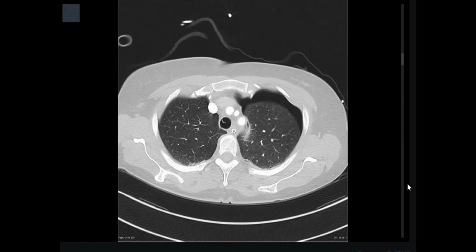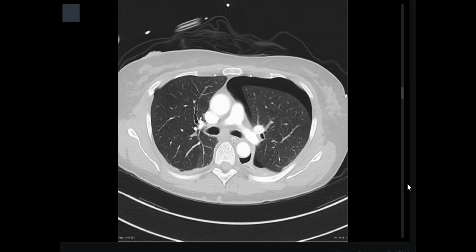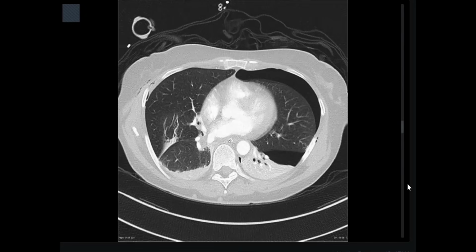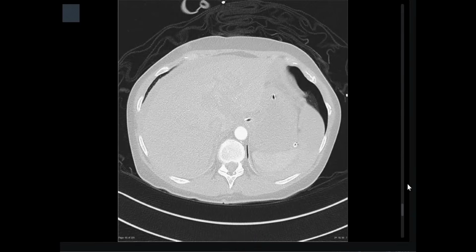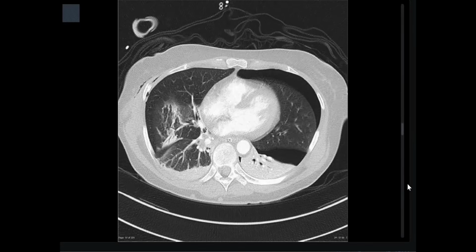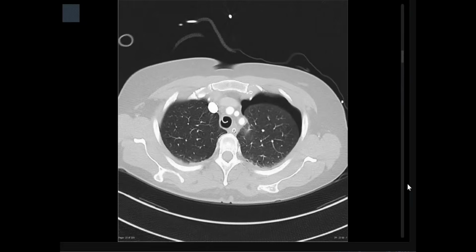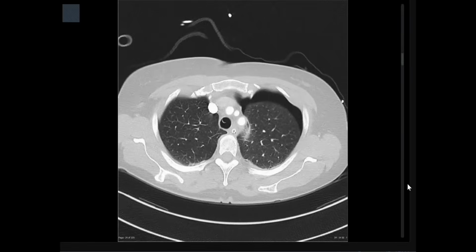So there's a large pneumothorax on the left with partial collapse of the left upper lobe, and there is also collapse consolidation of the left lower lobe. There is also collapse consolidation of the right lower lobe, and there is no right pneumothorax that I can see. Good. You detected most of the findings, but we have a new finding here. Can you comment on the left lower lobe?